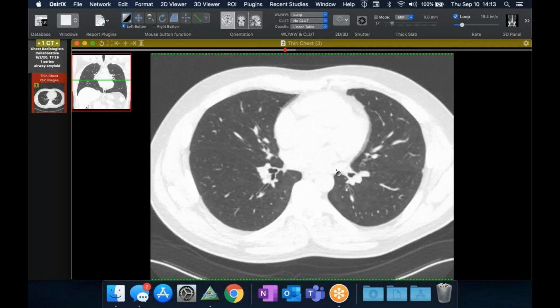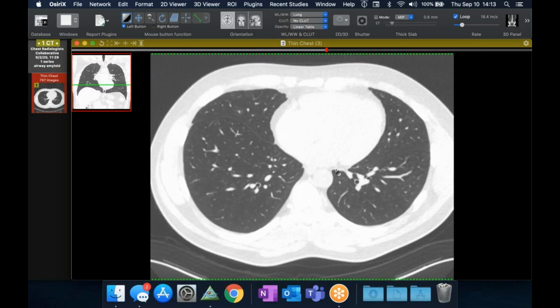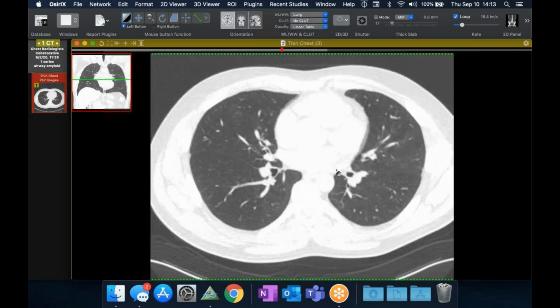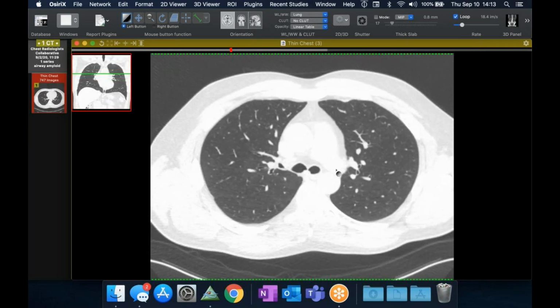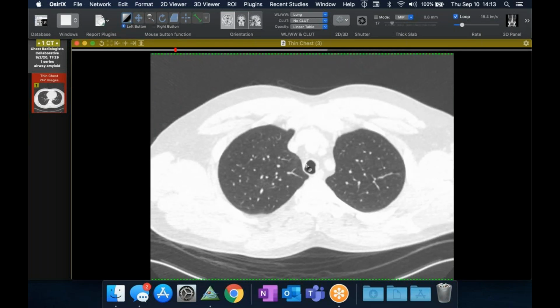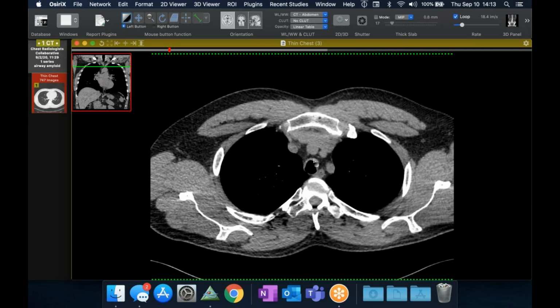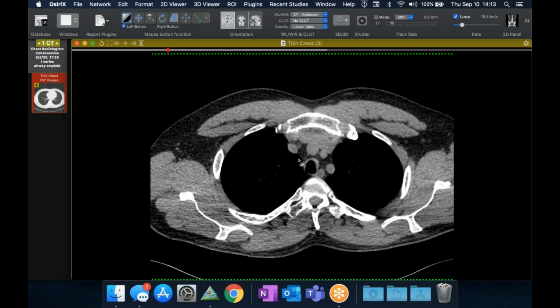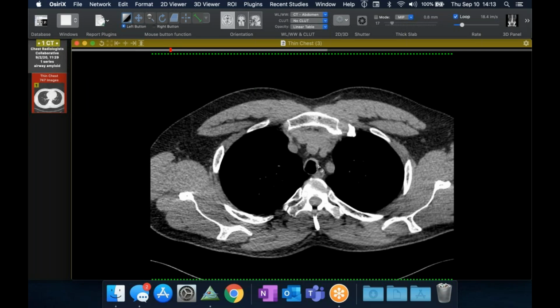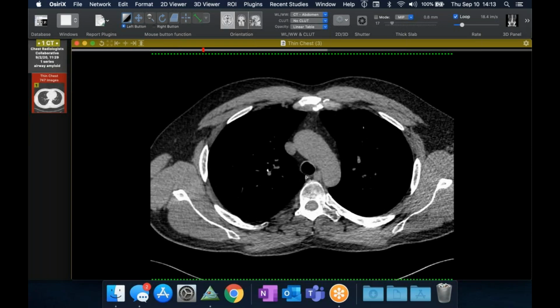And we talked about this, I think, several weeks ago, where you can use radiation therapy to treat this, at least to try to reduce progression of it. And as I said, we had a few patients here we've treated with radiation, but if I just saw this without any other information, I'd be a little skeptical, just because in my experience, all the amyloid cases I've seen are really diffuse. I've seen a couple ones limited to a bronchus. I've seen an amyloidoma, but sort of sparing the membrane here a little bit and then kind of jumps around would make me at least query something else as well.